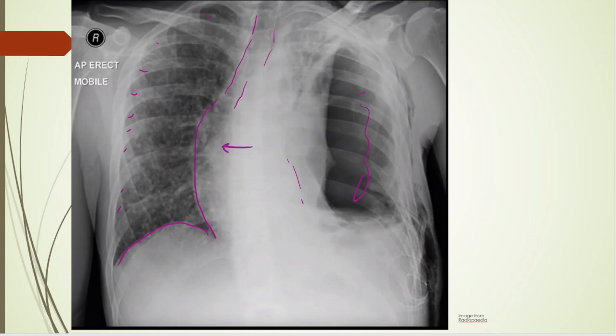So you look at, and this is the pleura right along here. And here is fluid or blood. You see this nice level that there is here. It kind of goes across straight. And that tells you it's a fluid. And you look over here and you see a lot of subcutaneous air here.